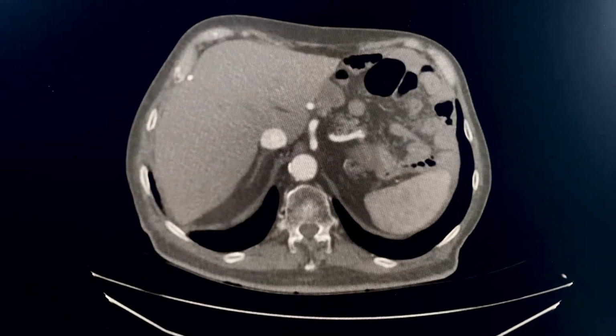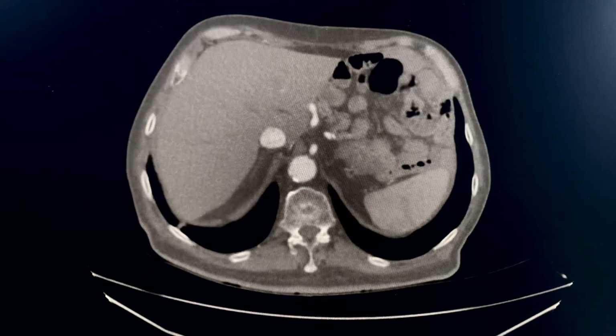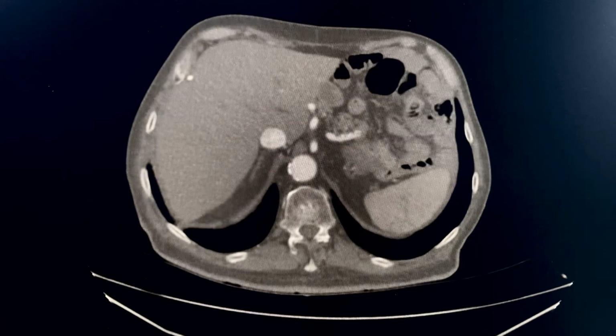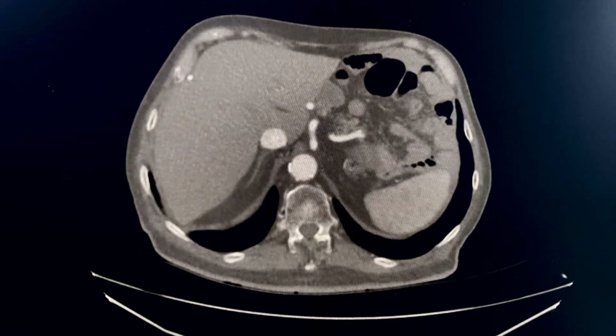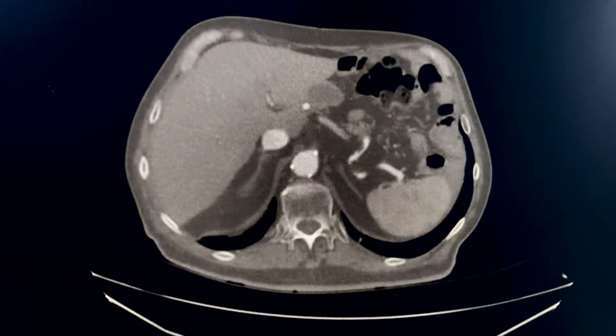Right, it goes through the diaphragm, and then immediately after it goes through the diaphragm, you have the first branch, right? Then you have your celiac trunk given off. And yes, its branches there. You have your common hepatic, your hepatic proper. You have your gastric branches there. All right.